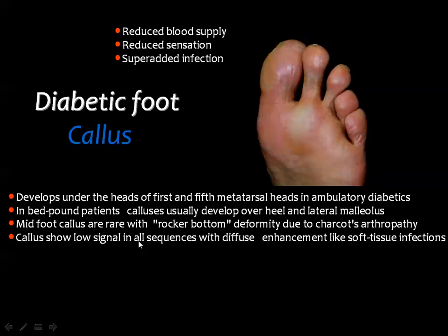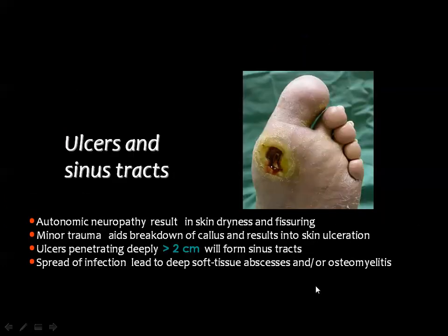But in bedridden patients, this callus will develop under the heel or over the heel and the lateral malleolus. Then this callus is made of indurated soft tissue. It will show low signal in all pulse sequences by MRI, and it will enhance if you inject contrast material.